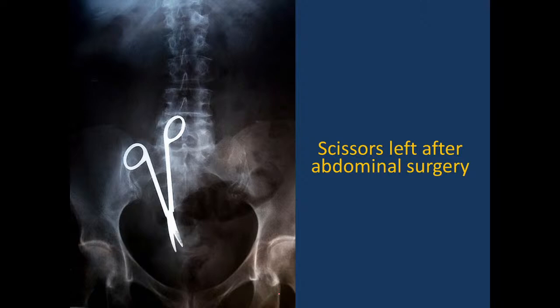But this is a patient with scissors left after a surgical operation. It's a pity, but I think surgeons need to reoperate on these patients and take the scissors out.